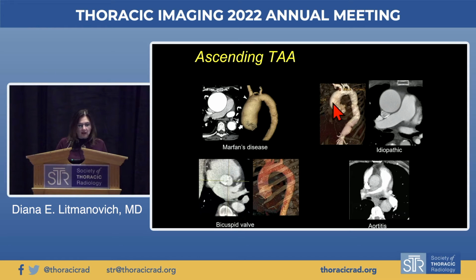this dilated ascending aorta, but we can see that the sinotubular junction is preserved. This is a case of the bicuspid aortic valve, just to show how we can appreciate it, and we know that in this particular case, this is the association with the ascending aortic aneurysm.